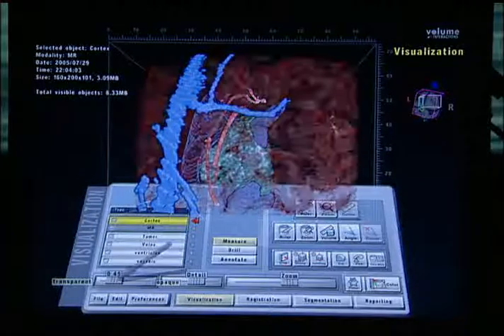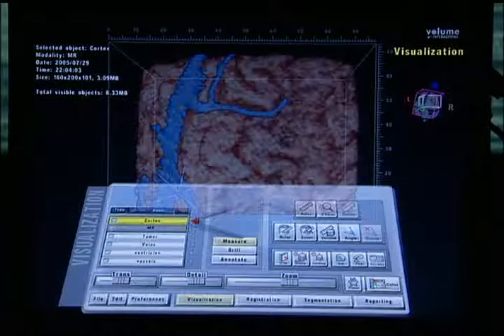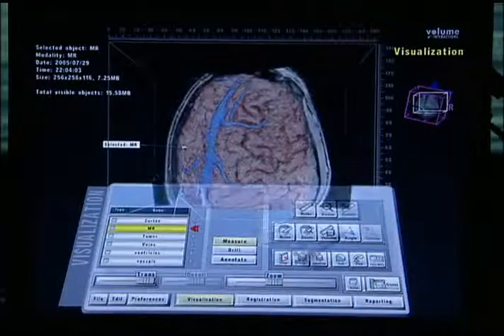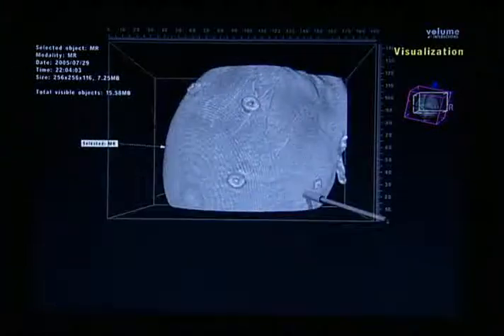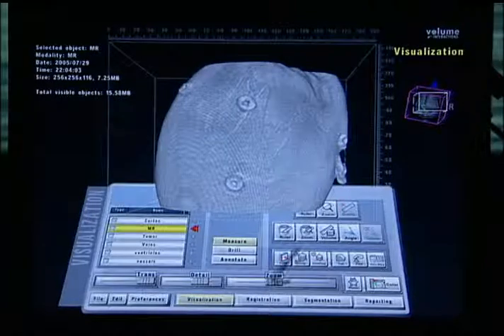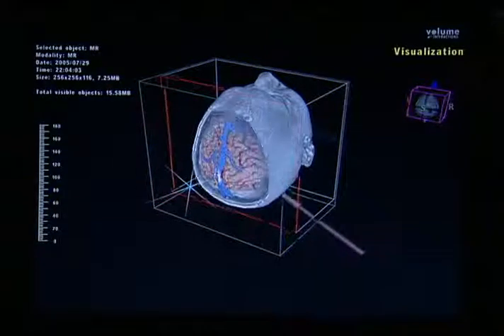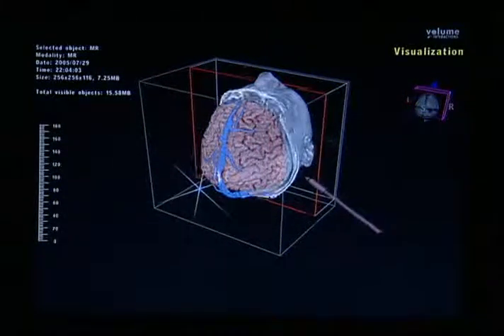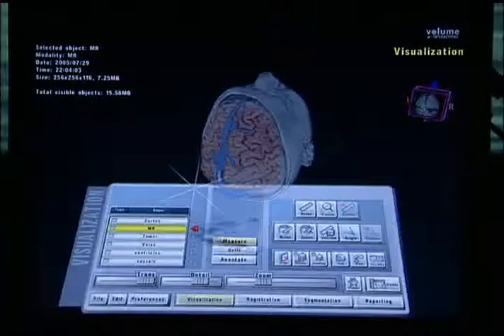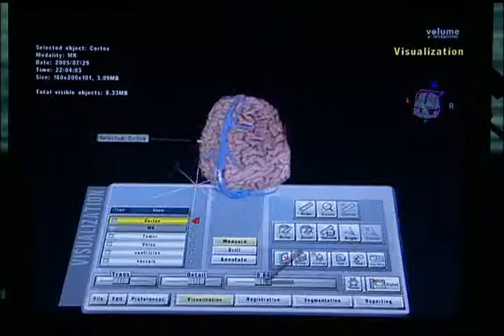If you go right back to the surface, you can actually see the fiducials on the surface that were placed. If you add the skin surface to this, that sort of tells you, you have the fiducials already on the surface. You can already tell where you have to make your incision if you wanted to make an approach, whether transcortical or interhemispheric. So given that, now you can window and take a look as you move through the cortex and see the tumor and move towards the resection.